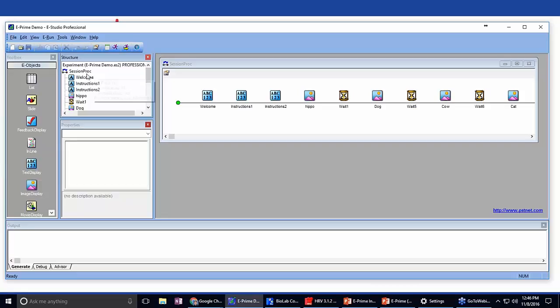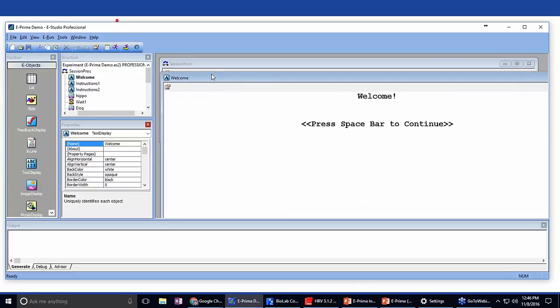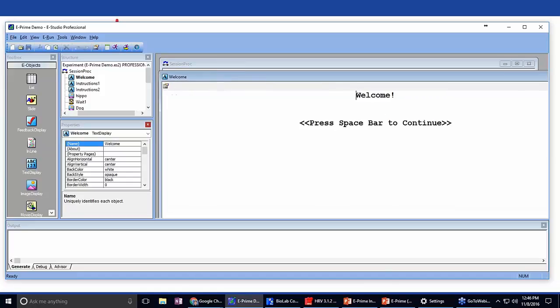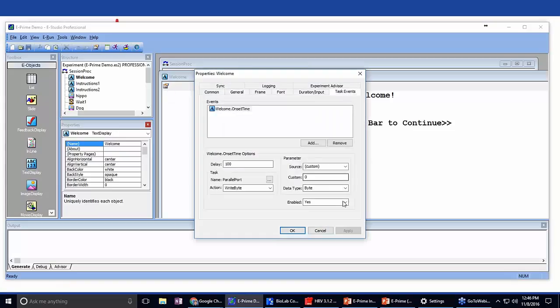And that is to begin your experiment, and you can do this in a bunch of different ways. But what I'm going to do is have my welcome screen, which is the first thing they see, send out a code. It's not going to be to begin acquisition, but it is going to clear the line to ensure that we're starting at a good baseline of 0. Since we're using that rising edge, it makes more sense to start from 0 and then work our way up.